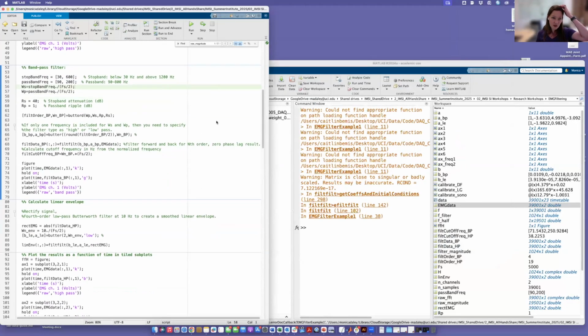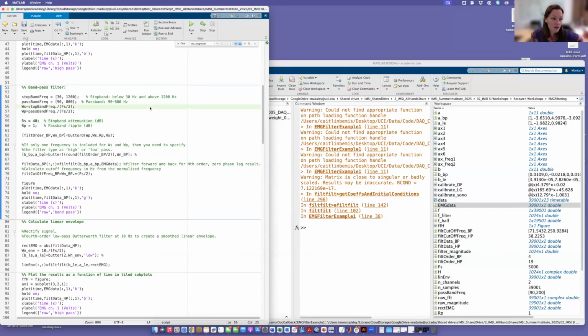Okay, so we've done a band pass filter. I'm going to put it back at some more reasonable values. What did I have originally? 1200 and 800. This is something I learned through trial and error, because if you look at the frequency settings that people mostly use for human EMG data, it's lower frequencies than this. And I realized that guinea fowl muscles have higher frequency components than human muscles.